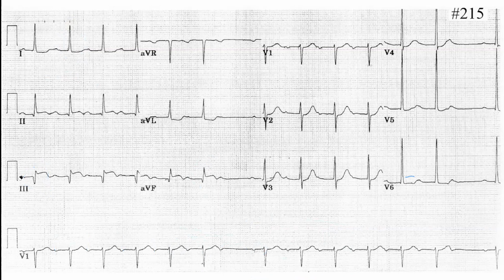I guess I would look at the ST segment next. No, look at the pathological Q wave first. Okay, it's very tall in V4, V5, V6. Wait, a pathological Q wave cannot be tall. It has to be deep. Oh, okay. Can you see it here, in lead 3? And here as well. Is it never pathological if it's just tall? Look, a Q wave is never positive. A Q wave is negative, and a negative wave cannot be tall. It can be deep, but not tall.